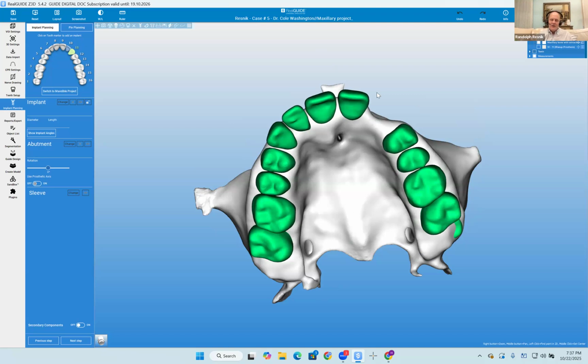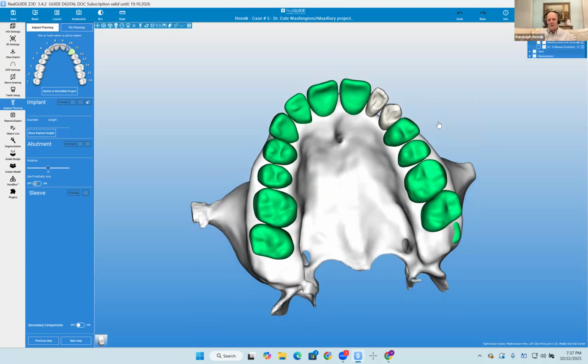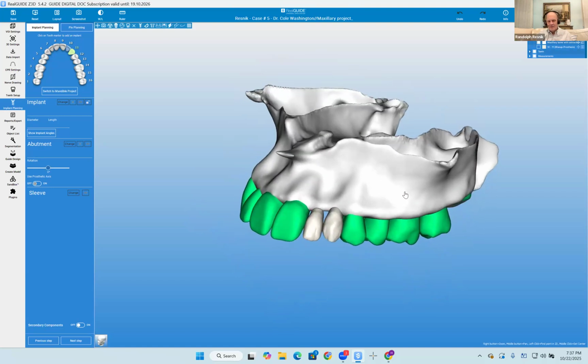Did you take some measurements on this, Hussein? Yes, sir. I did add 2 virtual crowns, Dr. Resnik, just to try to mimic the size of number 10 and 11. Let me just look straight on at what that looks like aesthetically. Okay.